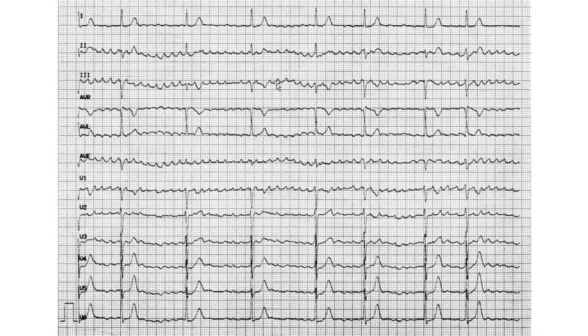The picture isn't too clear, but you'll be trying it out. So let's roughly say it is about 6 millimeters between the two peaks. So you take 1500 divided by 6, and it gives you 250. So 250 is less than 360.